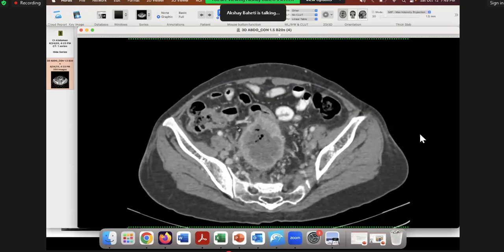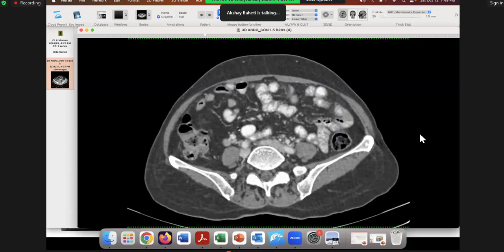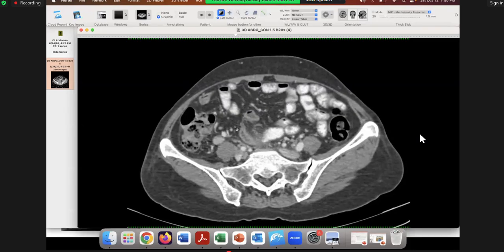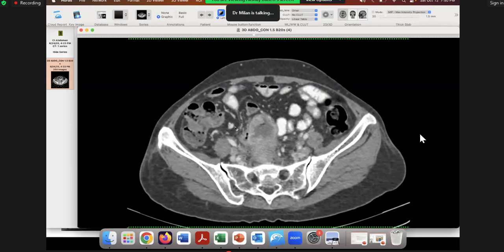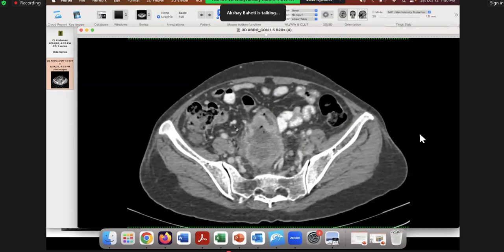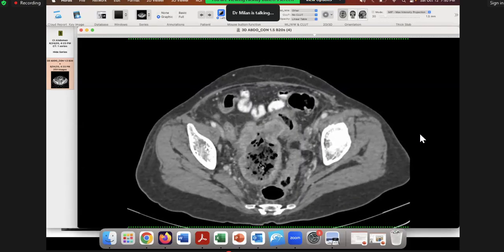And the other thing I said, the transverse colon is not redundant at all. It is right over here. And the other thing I said is then pelvic ileal loops, right? So now look at the ileal loops and let's see if we can find a communication or connection somewhere with the ileum. What do you think is happening here? Trace this loop. Yeah, so there is one communication with the posterior part of the loop. Right. Okay. Very good.